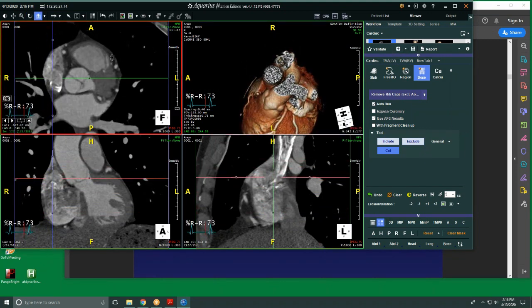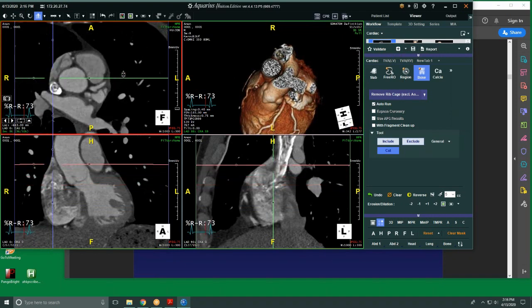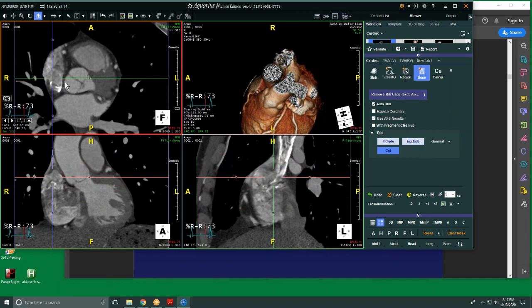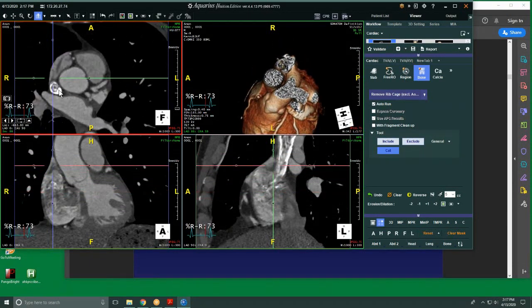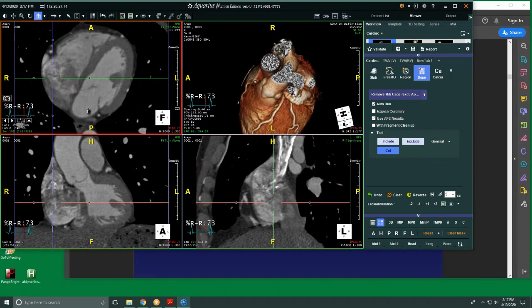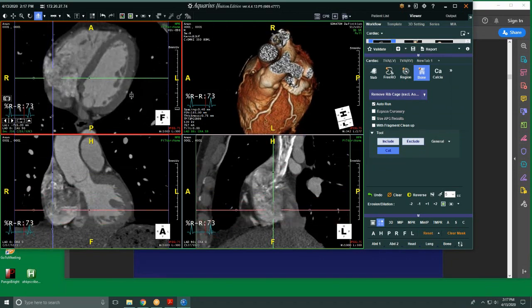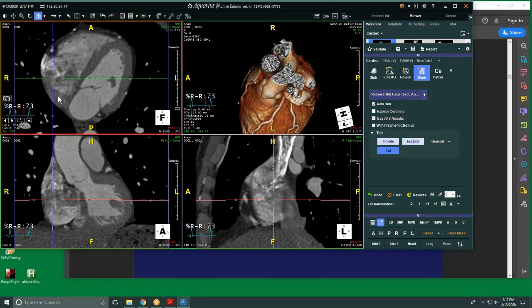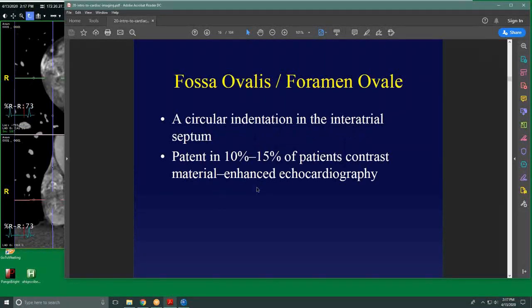Just beware if you're ever looking at cardiac CTs and you see something over there, just something to keep in mind. Other abnormalities that can exist here, most common is this is all just mixing artifact from contrast coming from the superior veins, mixing with unopacified blood from the veins of the leg on this arterial phase imaging. So very often you get a lot of mixing artifact here and things that look kind of weird. Ever any question about that, just call the radiologist and ask.